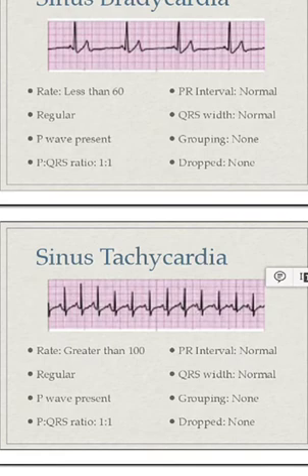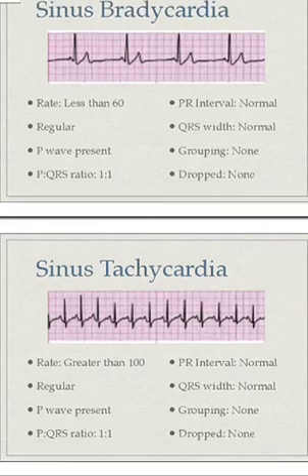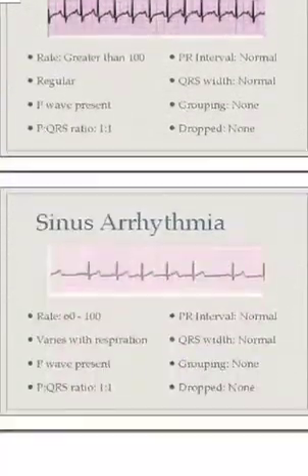Okay, so that's how we concluded it is a sinus tachycardia. Okay, now we come to pathologies.